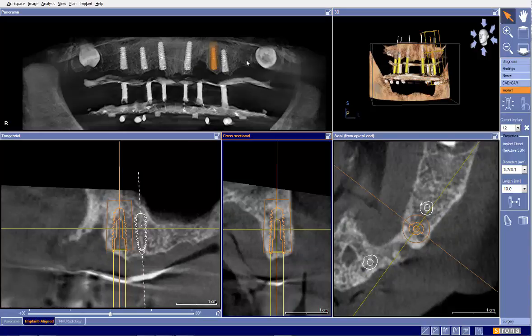So again, without a better scan, some more volume, and certainly without a better prosthetic scanning appliance in the volume, it'll be difficult to make a final recommendation here.